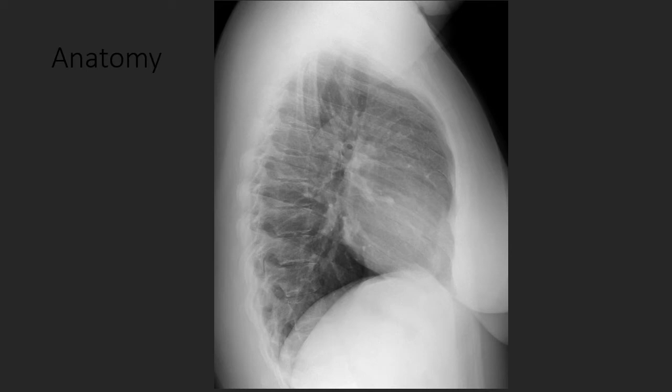Now let's see if we can try to identify the airways in the lateral view. Again, it's important to remember what structures are going to look like vertically oriented tubes and what structures are going to look like circles, that is, which ones we can see en face as circles on the lateral view. The most superiorly located lucency that we see here is going to be the trachea.